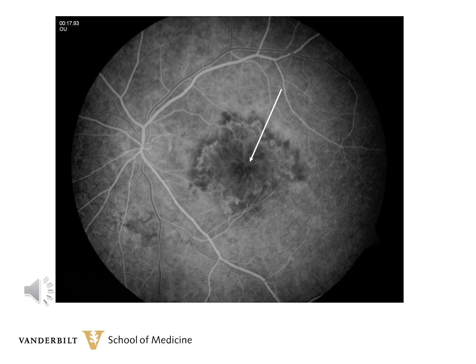His fluorescein angiogram is an example of a type 2 neovascular membrane. The photograph highlights many of the classic angiographic findings of this type of membrane. First, note the origin of the net. The arrow points to that. Then, note the spoke-like pattern growing from the source out to the leading edges. While you can see the spoke-like vessels, they do not leak as much as the leading edges.